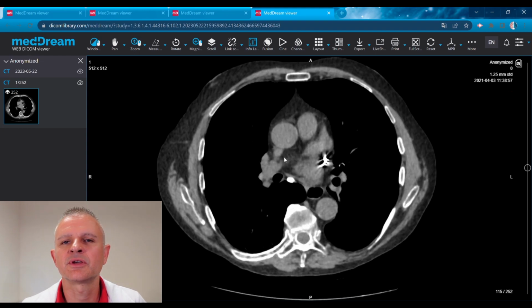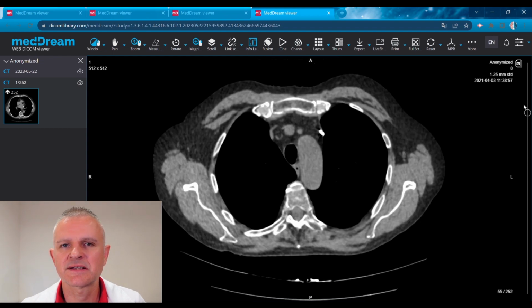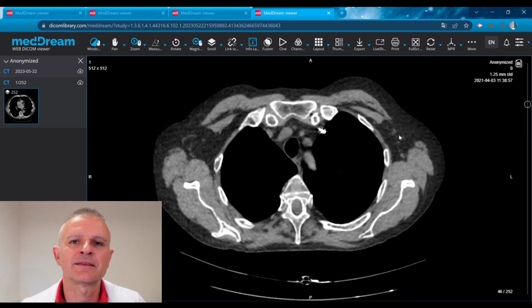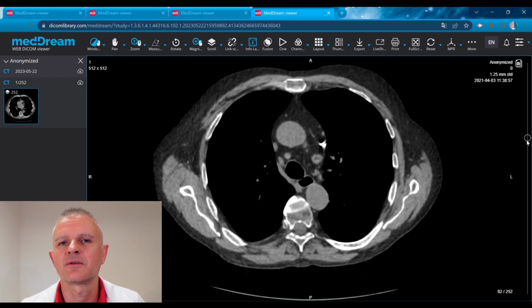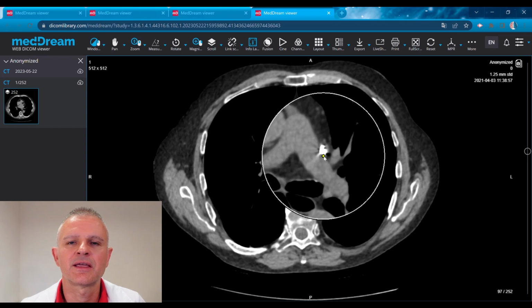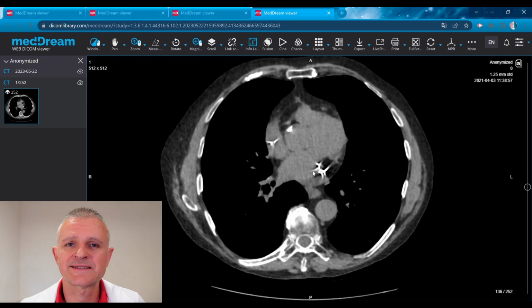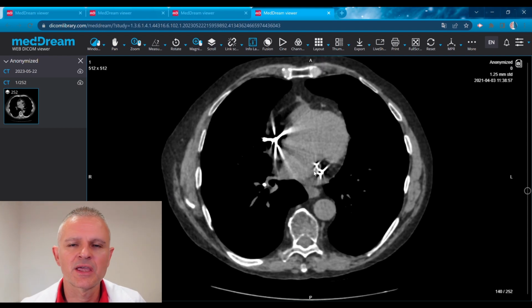And now if we go back to the lung apex and follow the pacemaker leads, you can see that there actually is a left superior vena cava, which passes next to the aortic knob, the left pulmonary artery, and finally it enters the coronary sinus and terminates in the right atrium.